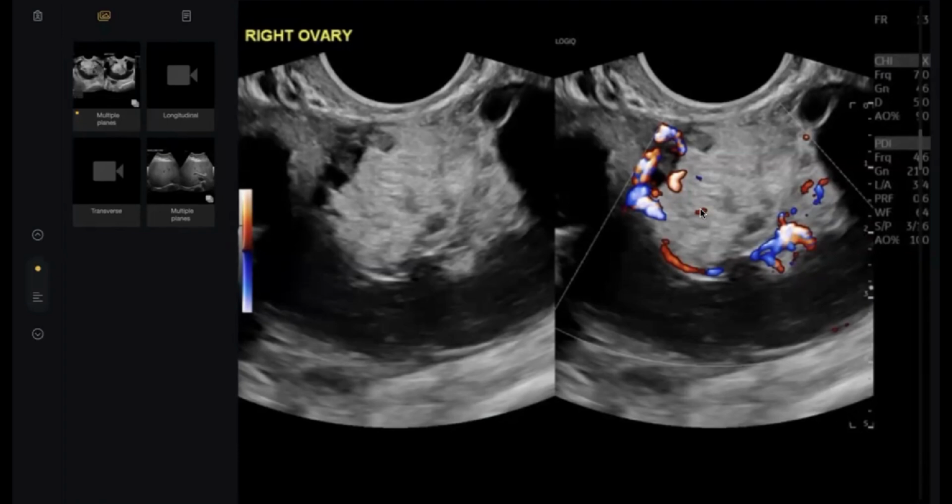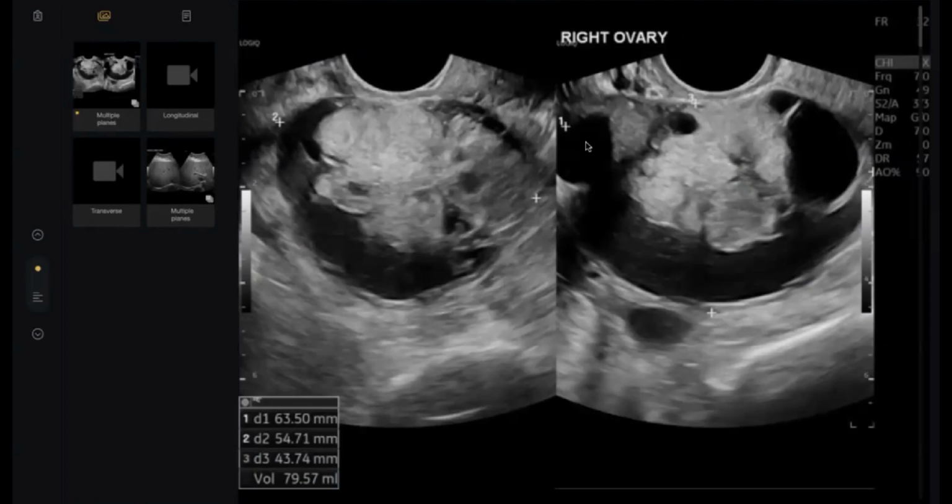So what's your diagnosis? I'm also able to see some cystic lesion. This is cystic, or cystic solid. It appears cystic. So is it suspected malignant, aggressive or benign? I think, due to this increased Doppler signal, I would worry of malignant.